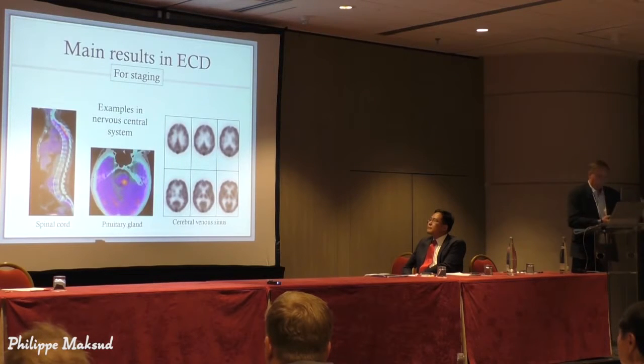One application of PET is staging. Here you can see some examples in the central nervous system, with infiltration of the spinal cord, pituitary gland, and cerebral venous sinus.